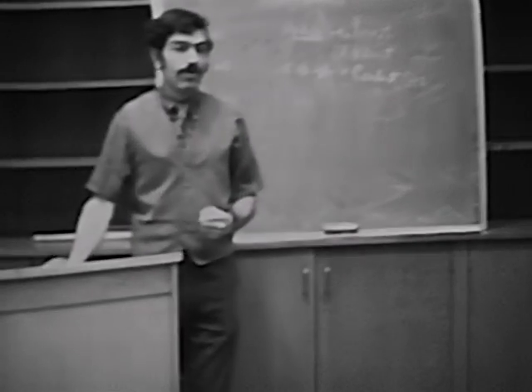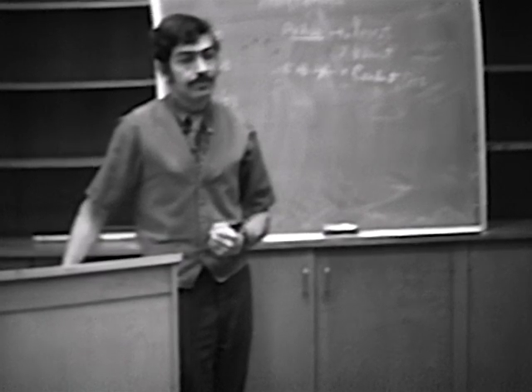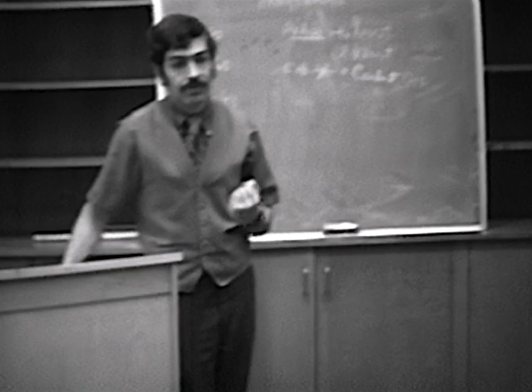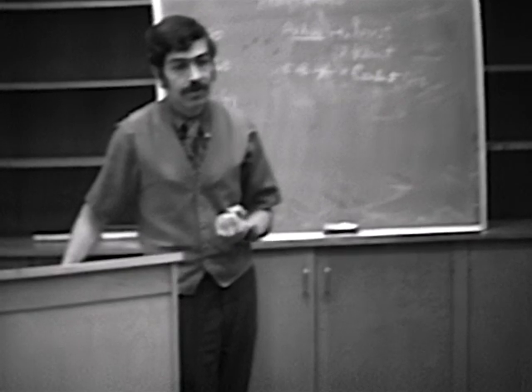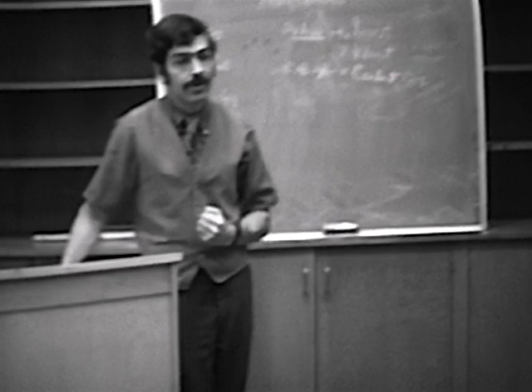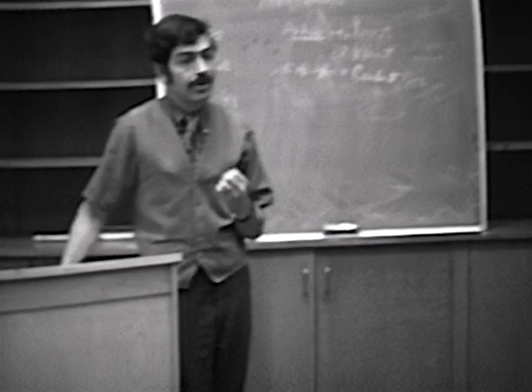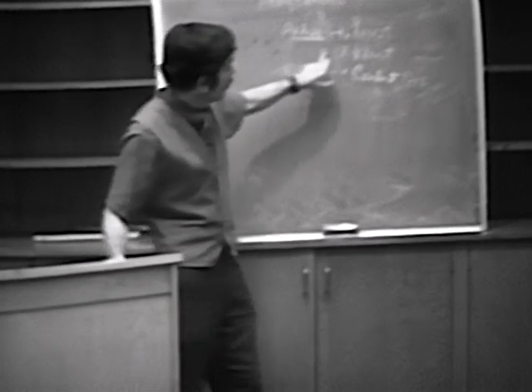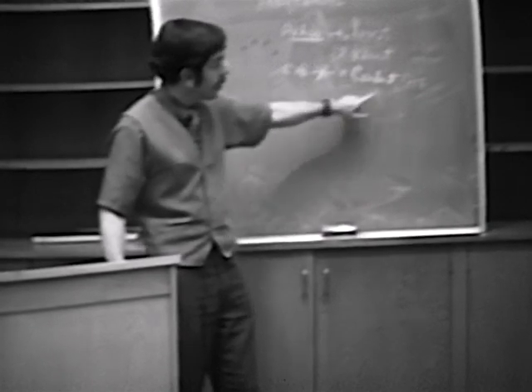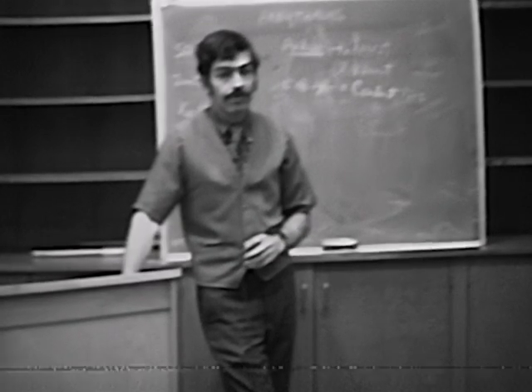So in AV dissociation, what you have is that the lower focus is going faster than the upper focus. In other words, take a patient that has ventricular tachycardia. Ventricular tachycardia is an example of AV dissociation. The ventricles are firing faster than the atria, and they're taking over the rhythm. Okay. What do you see occasionally in these electrocardiograms in patients with AV dissociation to show you that they do have conduction? They do have normal conduction. You see a certain kind of beat that tells you they have normal conduction.